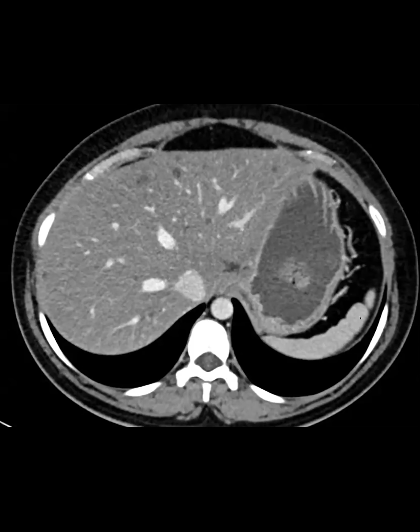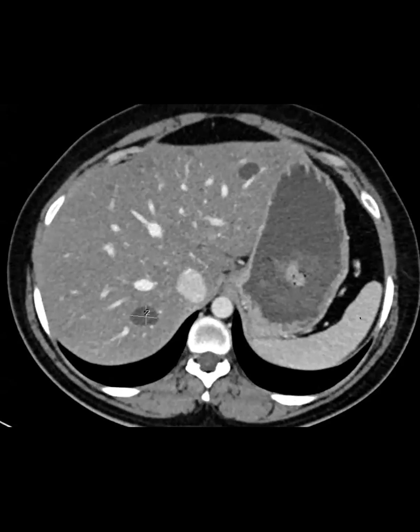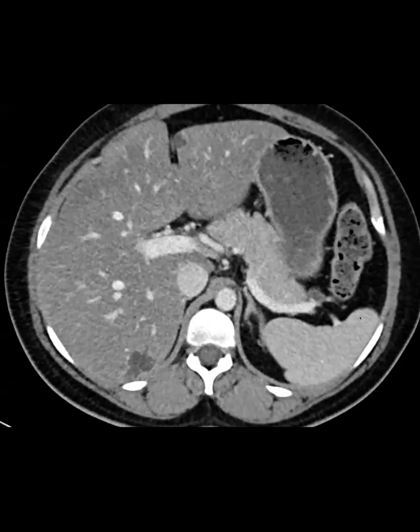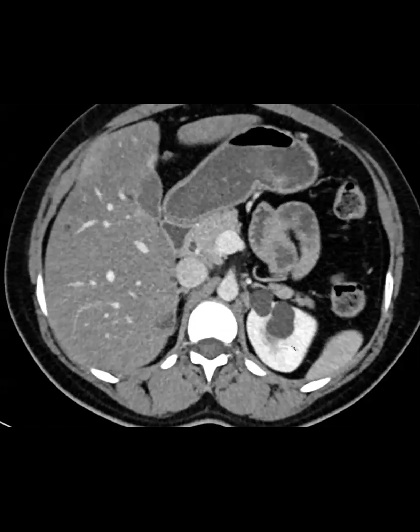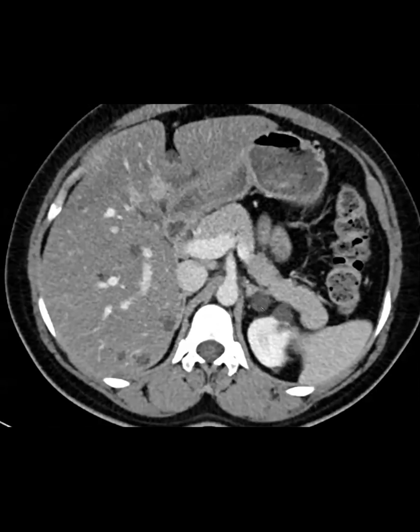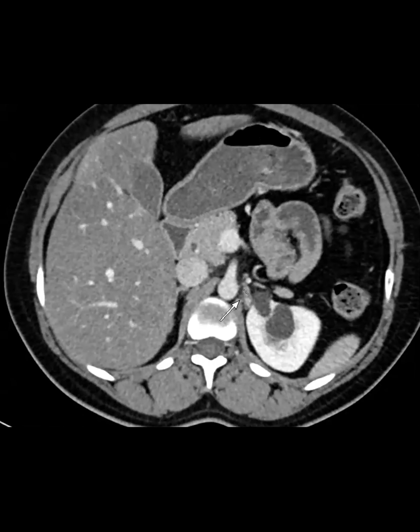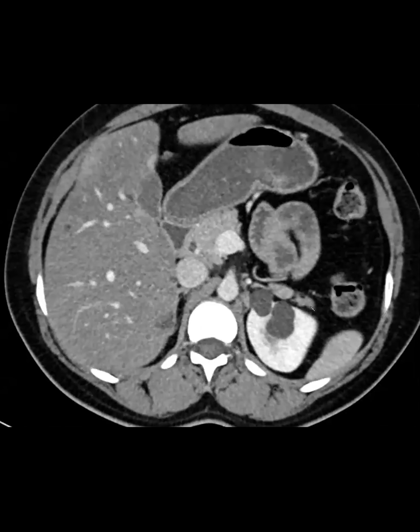This is just my companion case to the one that Teresa just showed. You can see that the liver is fatty and that there are multiple cysts within the liver. But the lesion that we were looking at was this enhancing ovoid lesion here. It's just a nice companion. We've got our adrenal gland right there, a renal cyst behind it, and then this enhancing celiac ganglion here. So don't mistake it for a lymph node or for an exophytic adrenal mass.